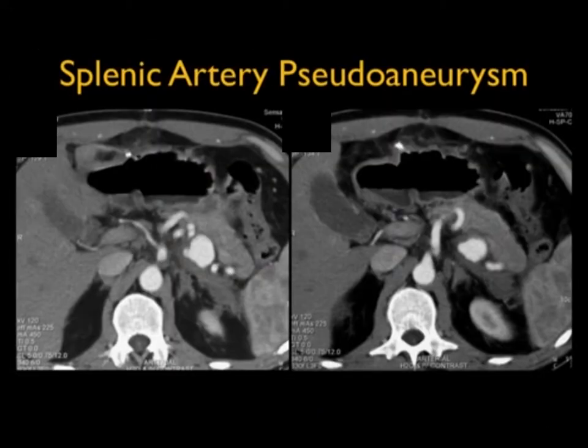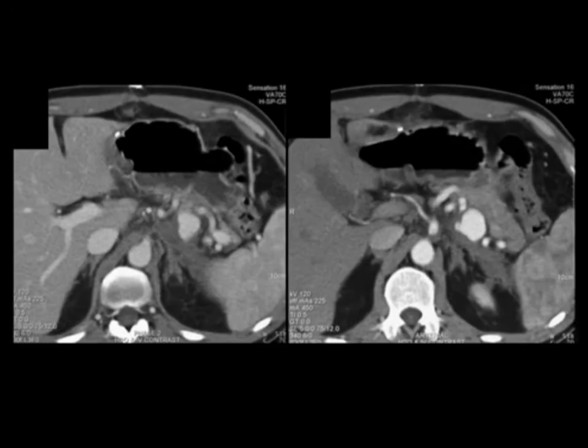This was a patient, very interesting. The patient has this aneurysm. Now the patient had fallen down and was discovered down while exercising. He was worked up at another hospital, but they found nothing but some blood. And you can see here the obvious pseudoaneurysm. The thing was, they were looking for pseudoaneurysm. It wasn't like they missed it, but he had so much blood it had compressed the pseudoaneurysm. This is a couple weeks later, and now you see the pseudoaneurysm with the blood around it.